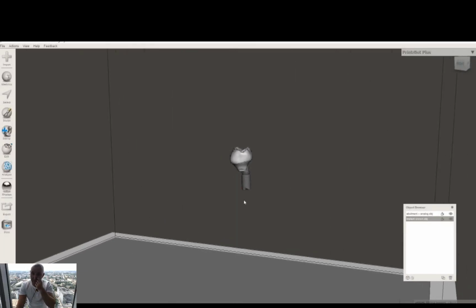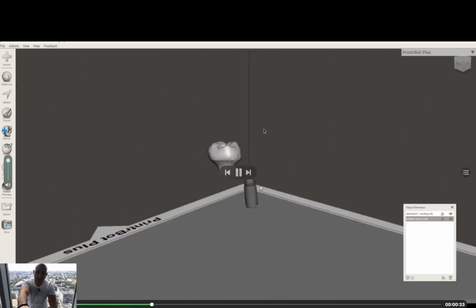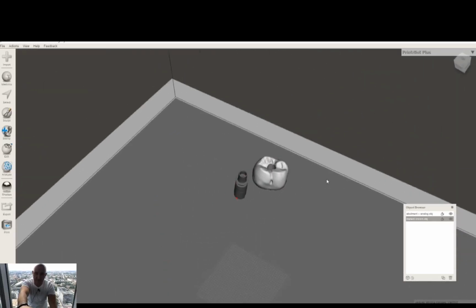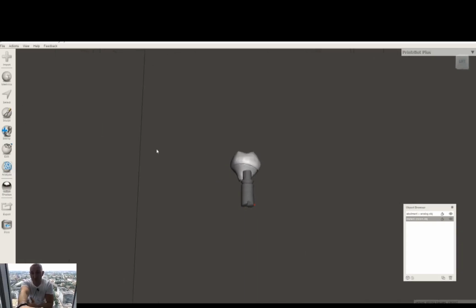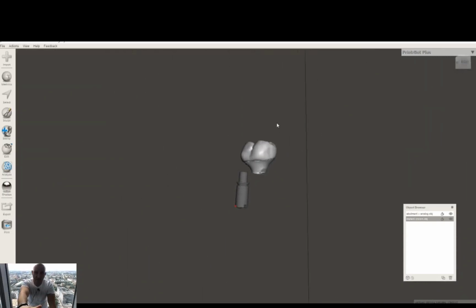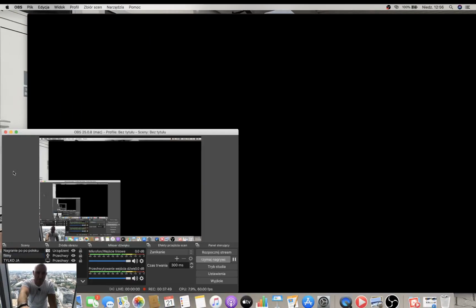And you will be able to design a temporary implant crown, which you will be able to screw into implant right after the implant placement if your primary stability is good and you want to go this way, or you are able to screw it maybe after a couple of months. It's up to you, but you are able to do everything here in Meshmixer very easily. So this is a very good situation for you.